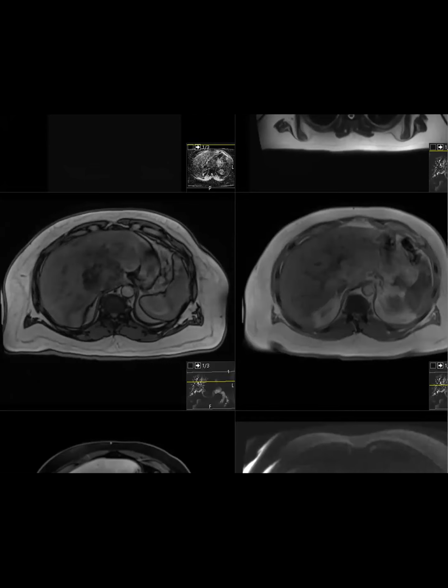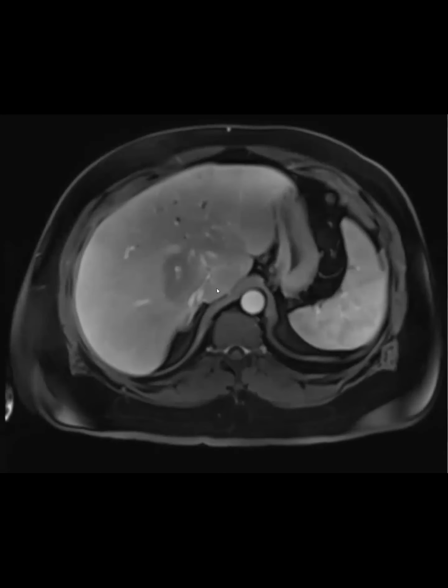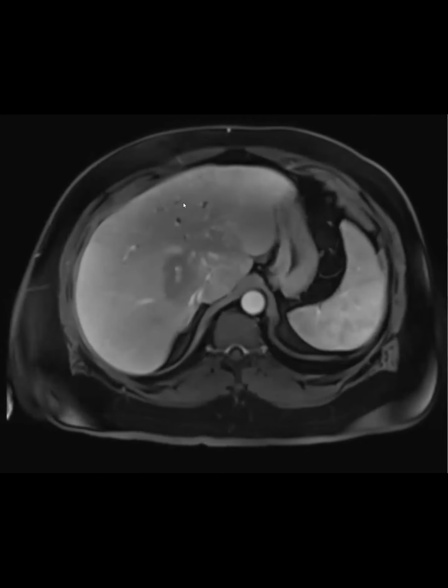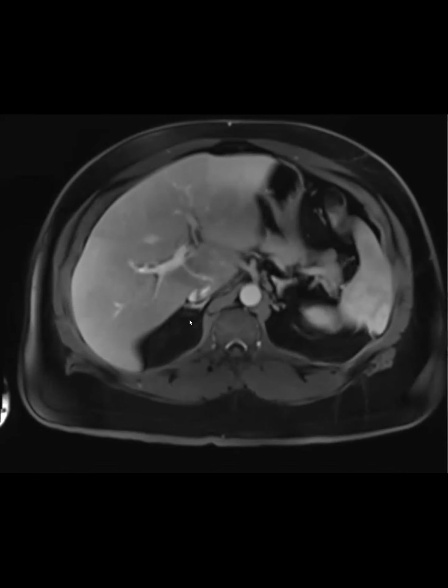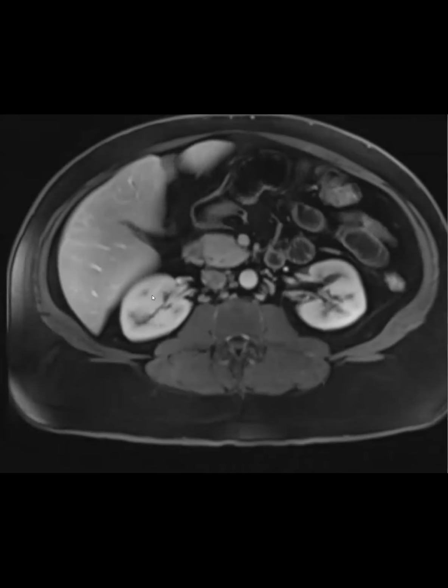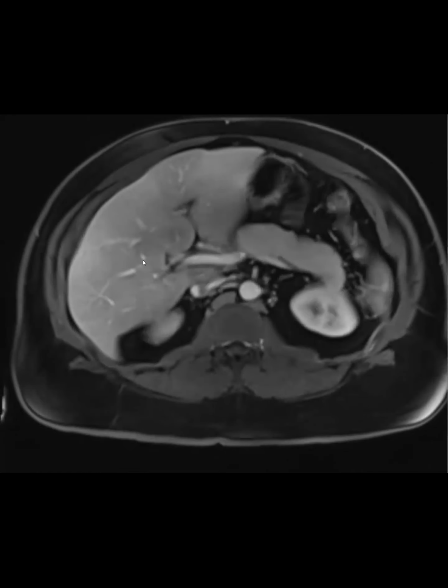So going back to my venous phase, we're just going to ignore that. We just have some focal fat there. And then you can now see the beaded ducts. You see these peripheral ducts are dilated, but then as we get centrally, they just disappear. We don't see a mass there. So we're worried, is this sclerosing cholangitis? And there is another finding in this exam.